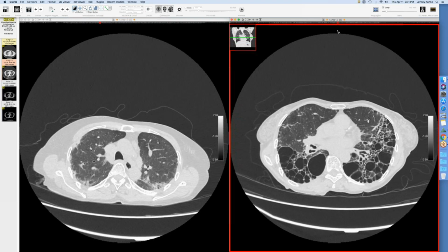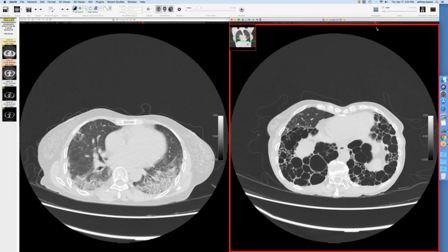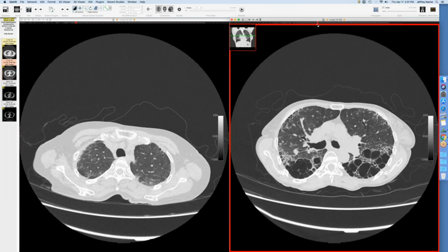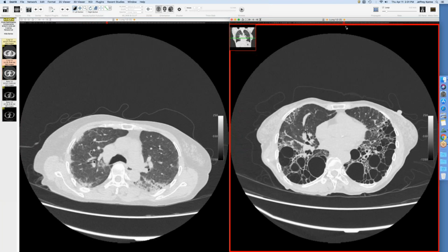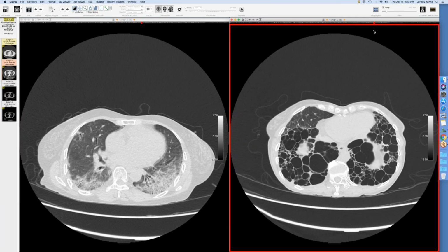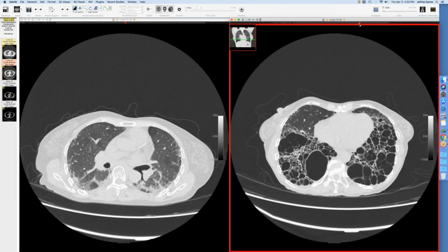I raised the question of connective tissue disease. I think I saw this one first without this scan, and it was one of my thoughts, and I don't think we have results of that. But as far as anyone knows at this point, there is no connective tissue disease. It may just not have declared itself, but I can recall UIP progressing rather quickly in some patients, and I've seen OP progress to fibrosis, but I can't recall seeing one that gave these giant cystic spaces like this. It's actually expanding the lungs as opposed to causing more volume loss. Right. There's not a lot of scarring, and that's why it's not really honeycombing. Right. There's no matrix of fibrosis that this is occurring in.